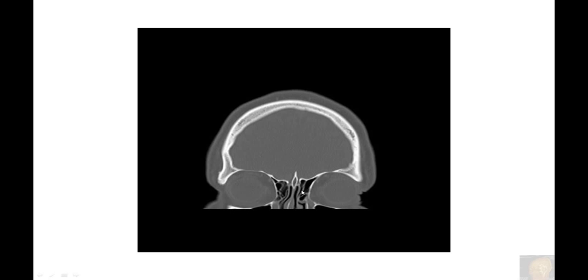They are the ethmoid air cells, and they have little septations within the air cells, which cause reinforcement. So even though the bone is very thin, when the eyeball gets injured, it doesn't usually break this part of the bone. They usually break the floor of the orbit, and I will show you a case later.